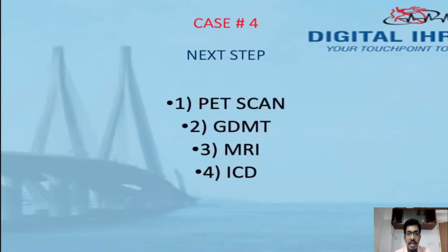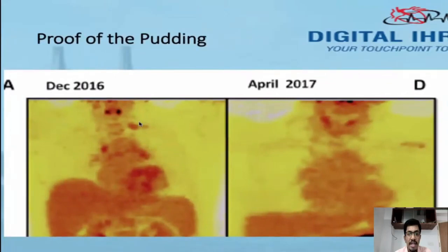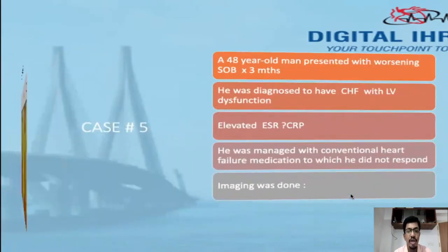That's my last case. So we did a post CT in this patient, PET CT, and this is the first CT showing the nodal and the myocardial involvement. And here you can see the patient is free of disease and also free of VT. Thank you very much for your kind listening.